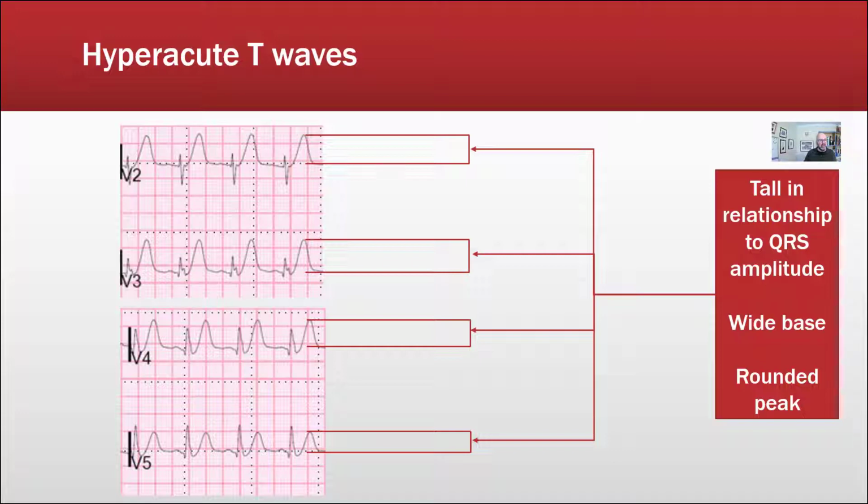Another rule of thumb to look at is whether the T wave is 50% or greater of the preceding R wave. Now, if this is the case, or they do exceed the 5 or the 10 millimeters, and we encounter this in the setting of cardiac chest pain, the assumption should be the early phase of an acute AMI until this is proven false. The easiest way to prove this false is to take serial ECGs if the LIFEPAK itself is not recognising ST elevation and starting to print out the 12 leads under its own volition.